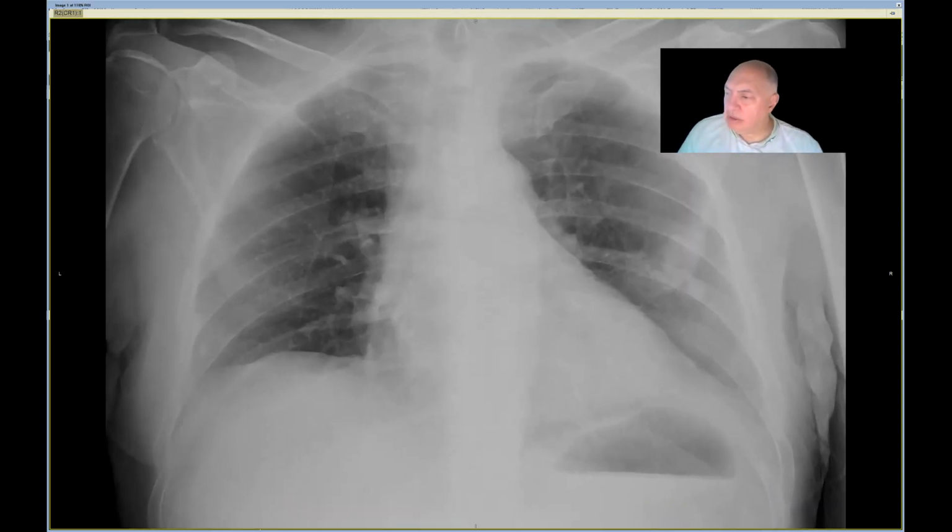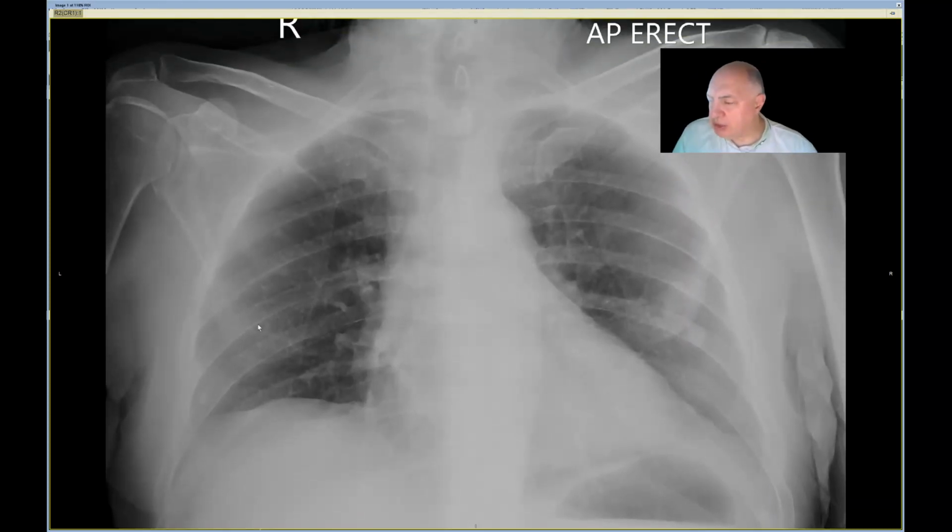So this is normal. The patient was quite short of breath following chemo, so the suspicion was that there was some underlying pathology in the lungs. So a CT scan was done. I'll just show the CT now.